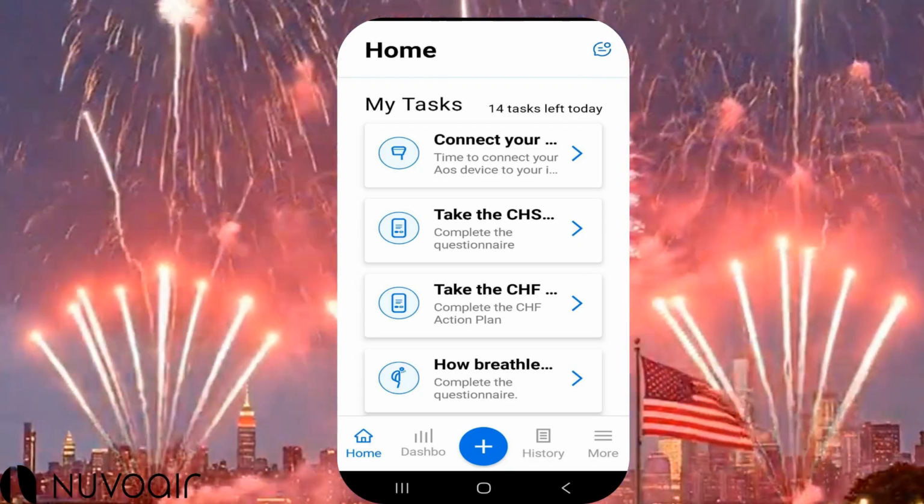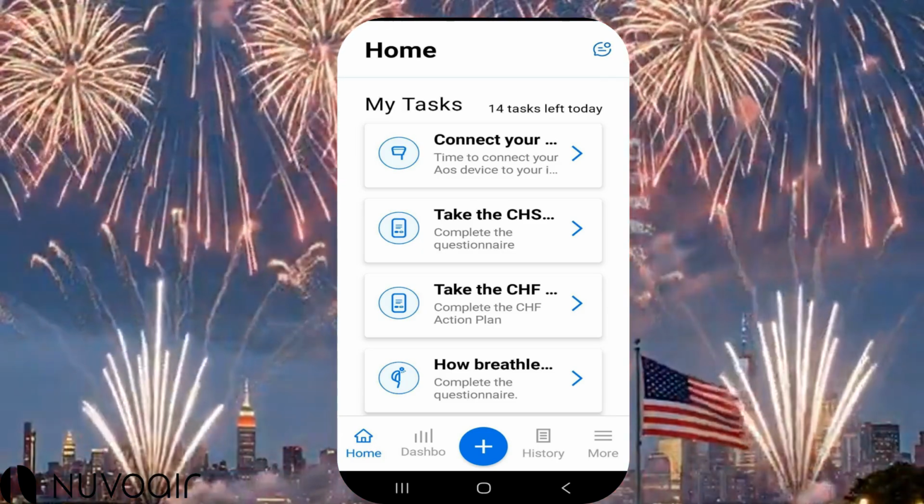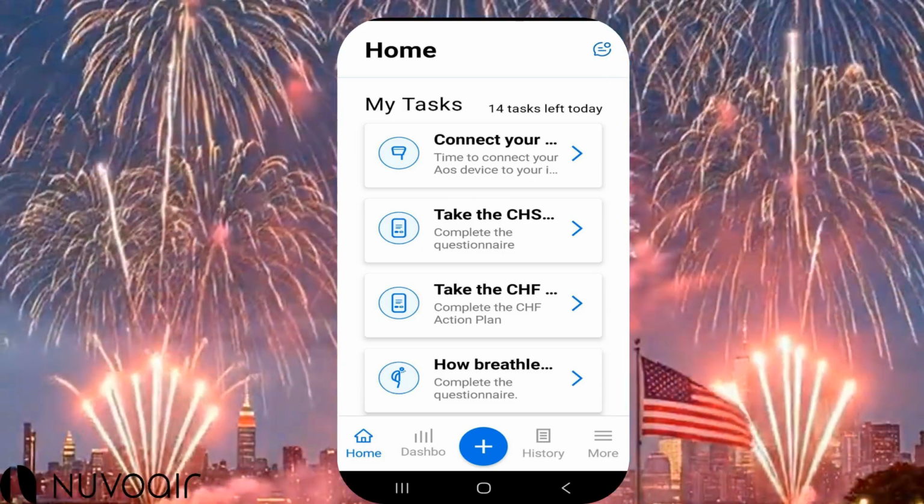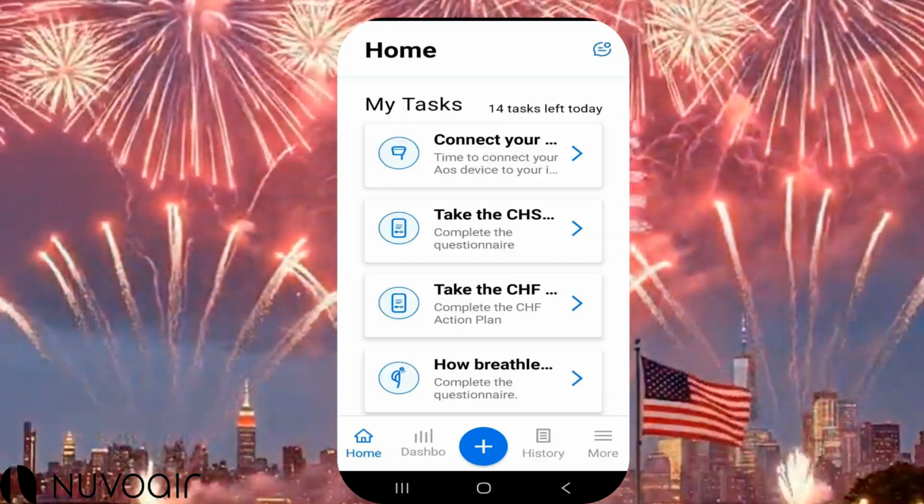Woohoo! You made it! I knew you could do it. You are officially on the homepage of your NuvoAir Home app. Stay with us. Chris is going to take it from here.